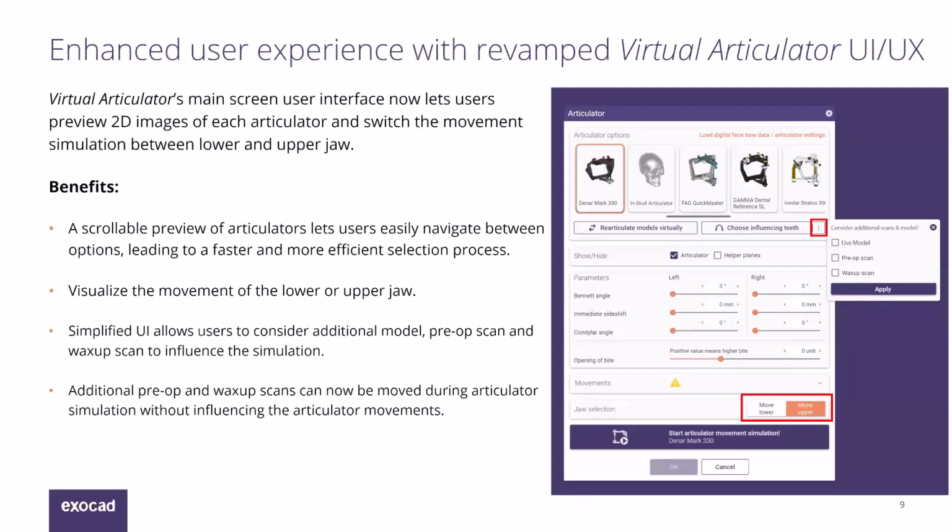Also with UI/UX changes, like you saw in the DentalCAD Model Creator tab, but also now the UI/UX changed with pictures in the Articulator tab. So you can see it directly here with a picture to have a better overview and a really easy, quicker, and better loadout for the articulator you need in this case.